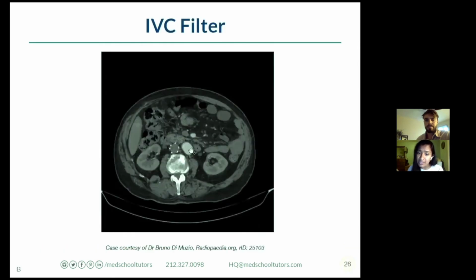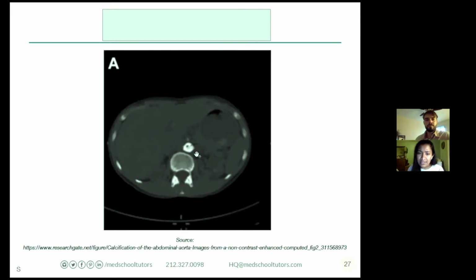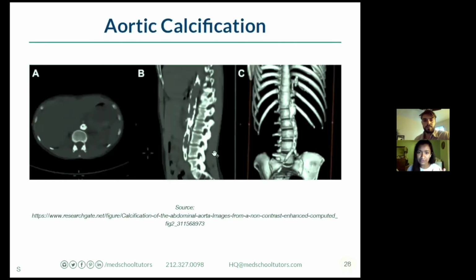If you look at the contrast in the aorta here, it's smooth and homogeneous, it looks the same throughout. Here you see there's a little spot here, a little spot here. The periphery is a bit brighter, and inside it's not quite as bright. So this irregularity gives you the hint of, is this a man-made thing or is this the body doing its thing, right? Same idea with contrast. Contrast is man-made, so it's nice and uniform. The whole idea of this IVC, man-made, nice and uniform. The human body is just depositing calcium wherever the heck it wants. So that gives you the hint of, does this look like a very uniform structure or something abnormal? So this is aortic calcification, so severe atherosclerotic calcification.